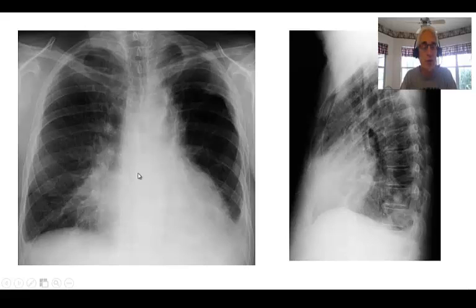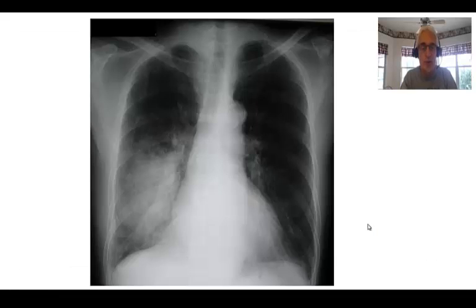The right lower lobe. We look over here on the lateral and look as you come down. The retrocardiac area is totally shot. There's infiltrate obscuring the retrocardiac area and covering the vertebral bodies. He has an aspiration pneumonia, which loves to go down that straight shot, down the right main stem bronchus. Interesting. Aspiration pneumonia.